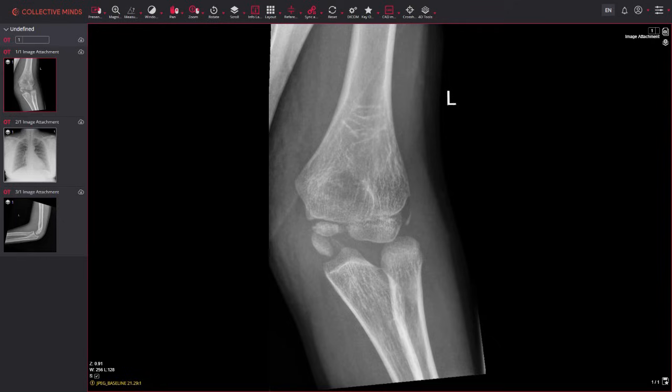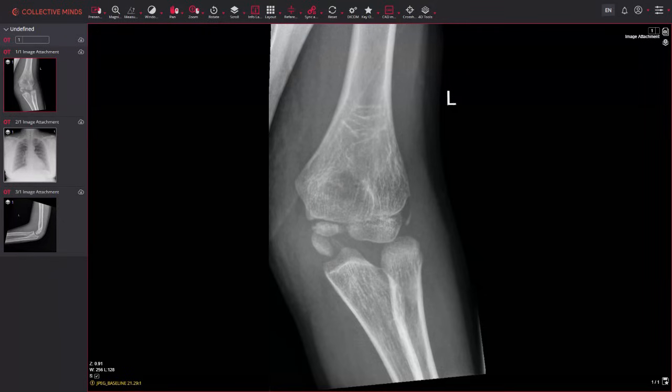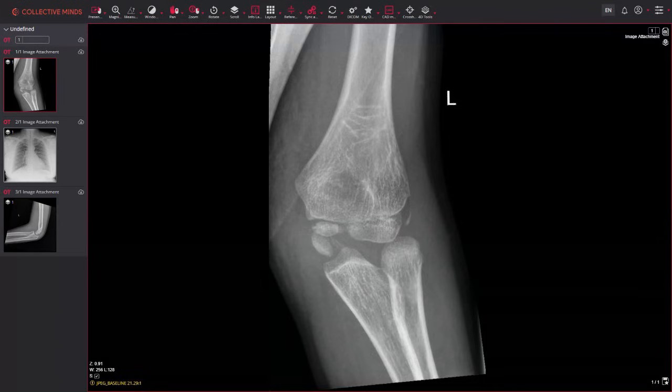So if we do further assessment of the bones then, in pediatric elbows, we have what's called CRITOL to help us, and you'll have heard of CRITOL before. That basically just runs through the ossification order at the elbow. And the first section to ossify is the capitellum here, after around 2 years.